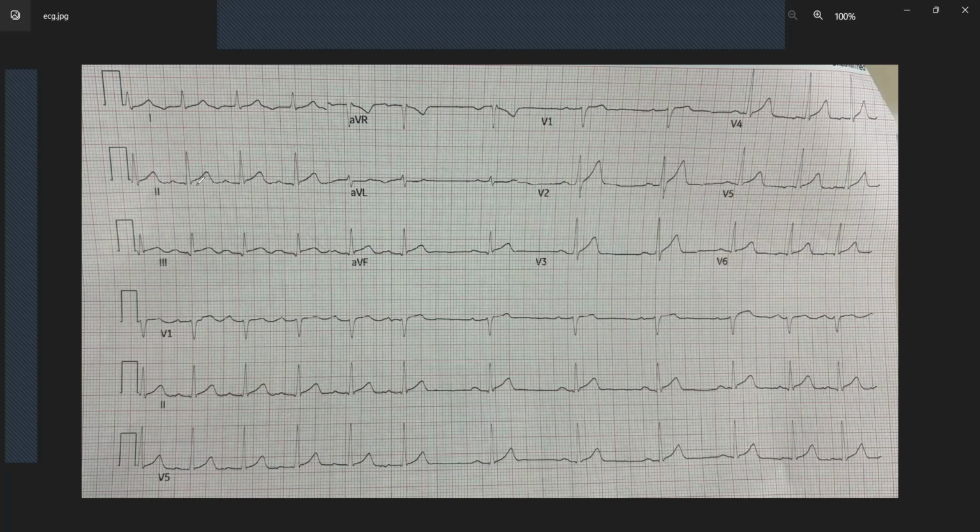And the one thing you'll notice is that we've got these slight ST elevations going on. And we've also got the slight dip in the PR segment. It's not tremendous, but it is there. Especially with an elongated PR, it's sometimes difficult to see, but it does seem to be slightly down, but we can't confirm that 100%, but there's definitely an ST elevation.